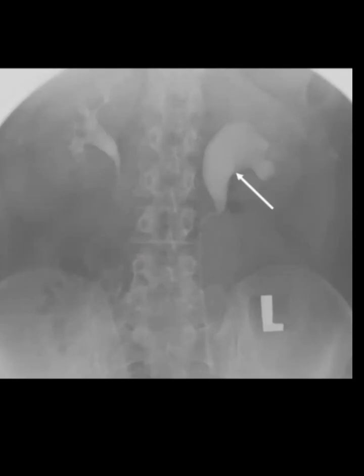It is also a problem on both sides, you know. Dilated pelvis on the left side. And where is contrast on the right side, in the ureter? And what about the right side? Here we cannot see the contrast in the ureter and the bladder. The bladder level is not shown here. Actually, the bladder is a little bit on the low side.